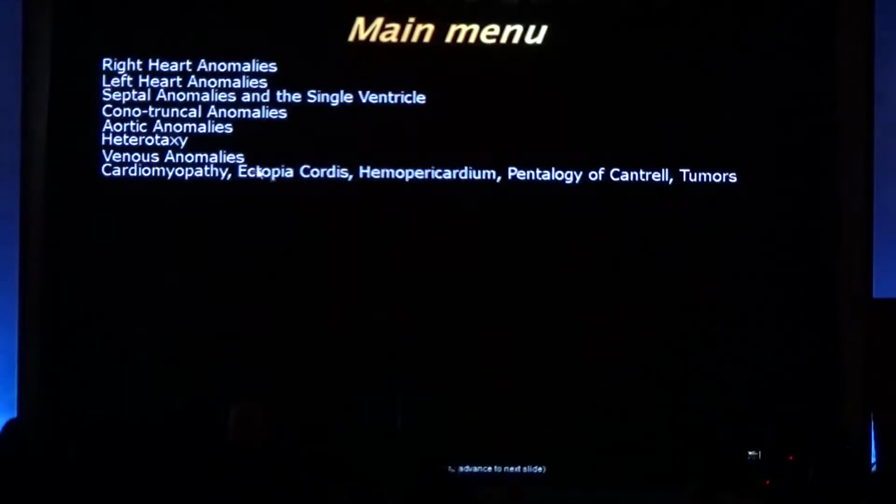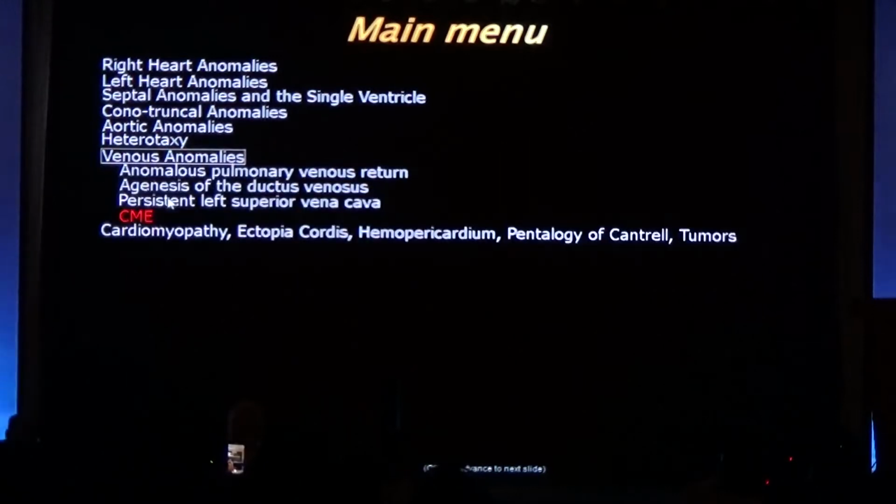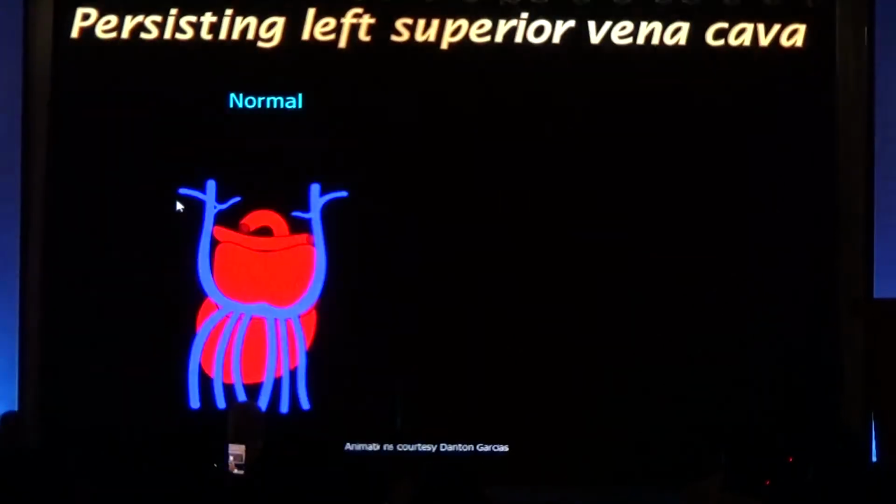Okay, so I wanted to quickly show you the persistent left superior cava, because I've shown you many examples of that yesterday.